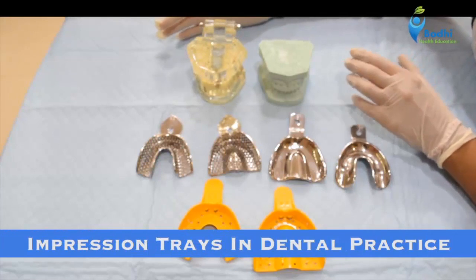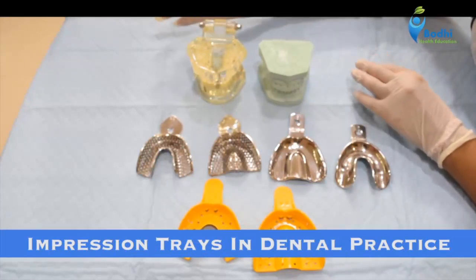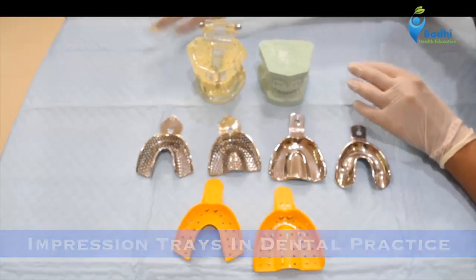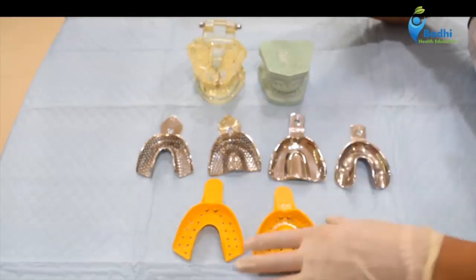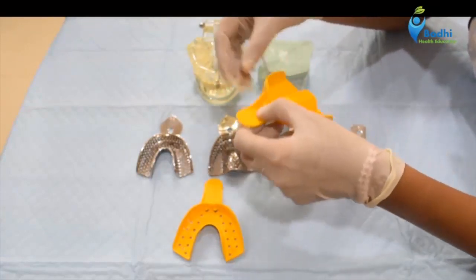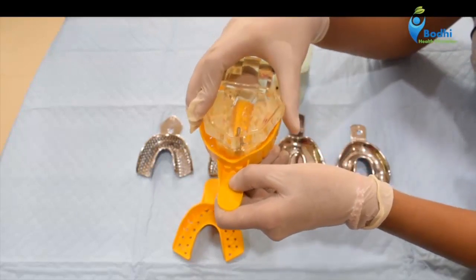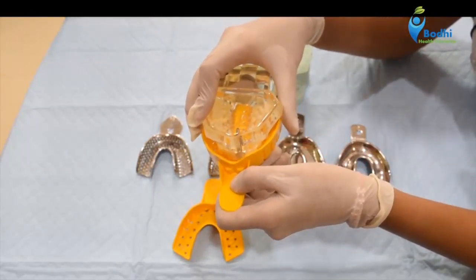Let me tell you about the various impression trays which are used in the dental clinic. What is an impression tray? An impression tray is used to carry an impression material while making an impression in the patient's mouth.